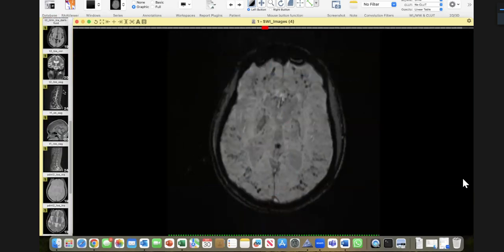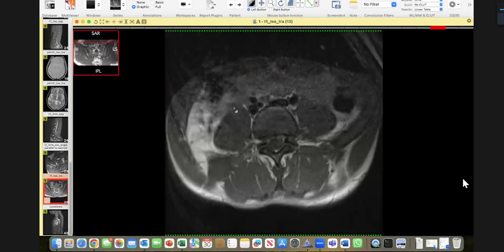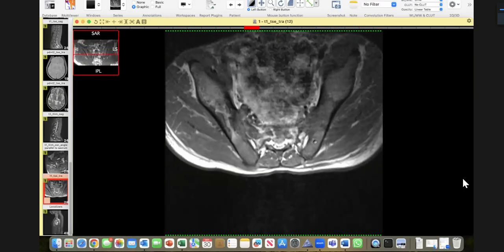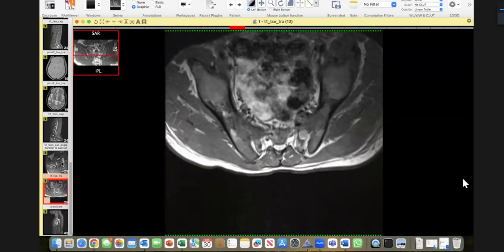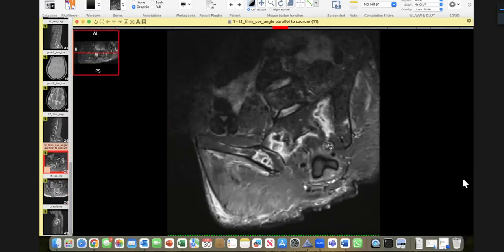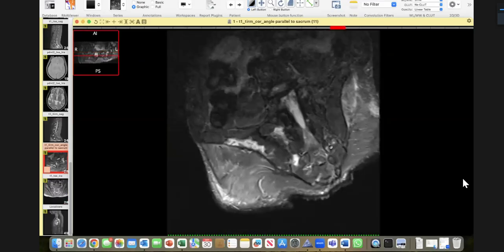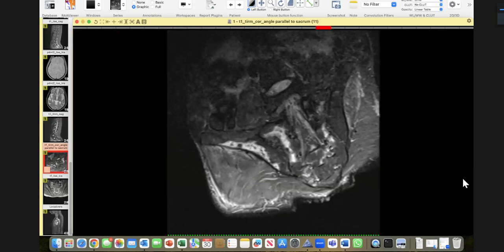And if the viva would have gone into that, because I had told you about backache, etc. And this is actually the sacrum and the pelvis of the patient, and you can see all of these infarctions. So sickle cell disease, please remember in your main viva, both sickle cell and trauma should be in your mind. And from today, this appearance should be in your mind. We call it the walnut kernel pattern on SWI.